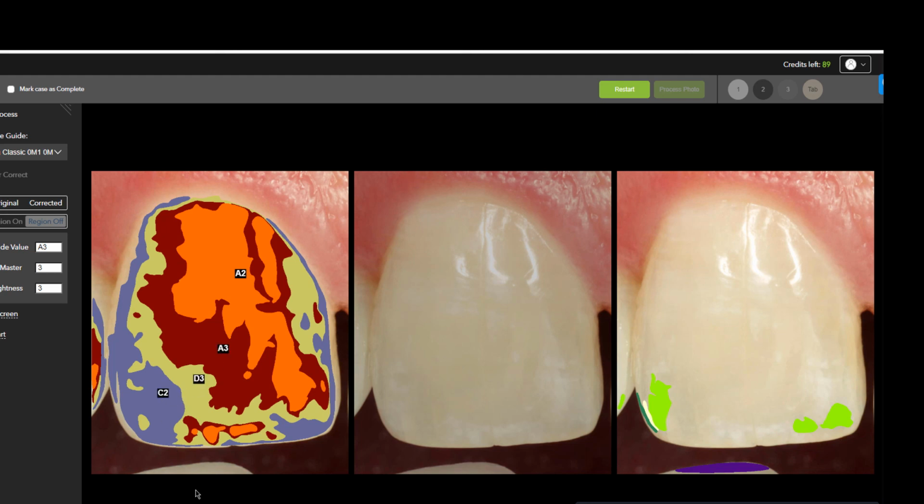So you can use it with a black, white, and gray or without. There may be certain conditions and situations where you want to find out if the photo processing is being done correctly with just a shade tab. So this is a good way to check it. There's other conditions where the shade reference does help in getting you the best shade.